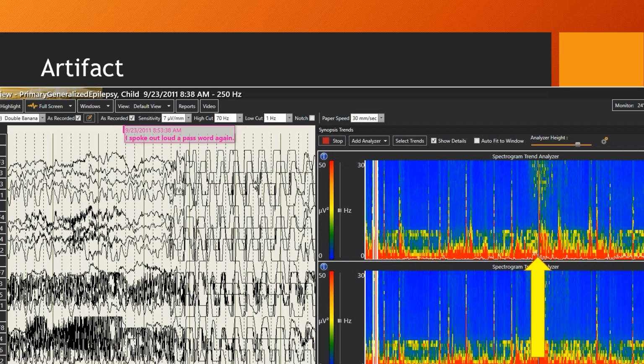Now, this is a different record. This is an abnormal record, and I just wanted to use this one to show you what we're seeing here. If you look at this record, you'll see where my cursor is placed, but you'll also notice that several of the other peaks in this spectrogram have this banded appearance, where it's kind of striped as the peak projects up. So you have power in different frequency ranges being affected when the patient has their episode.